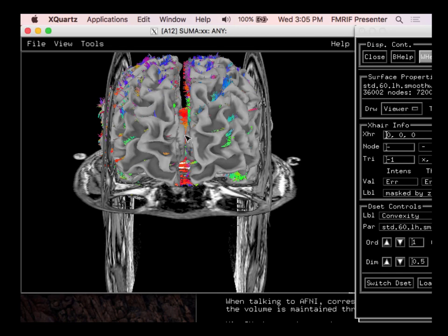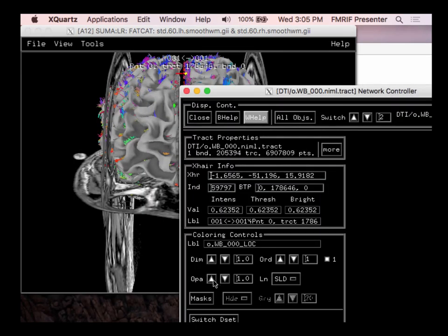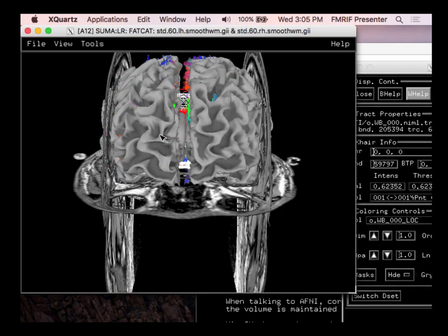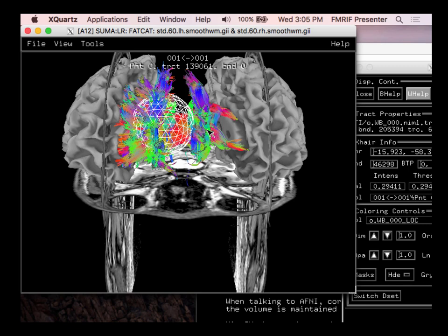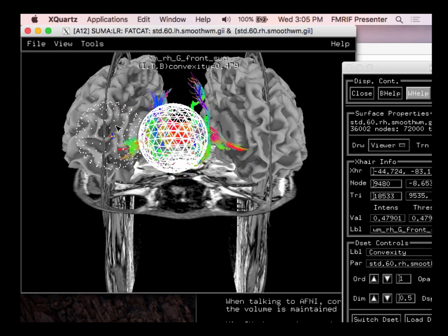And if I'm interested again in a subset of things, then I can bring back my magical region, and I can move it around and investigate things. I can click on the tracks to move it around, and I can also click on the surface, and it remembers where it would be when it's closed. So this is a visual representation. So I can say, okay, I'm clicking on this part of the surface. If it were closed, it would be here, and that's where it would intersect these tracks.